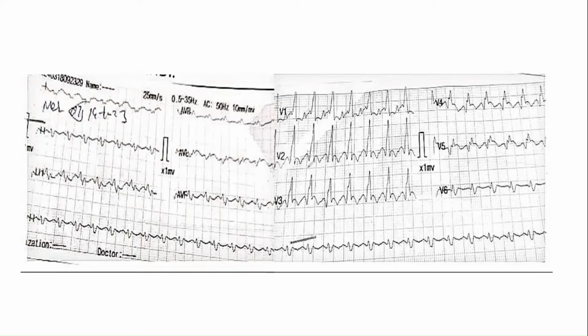You can see, look at over here. They are pretty much the same morphology with the same timing. It is regular. So what do you think these waves are? You said it's a P wave. We did something with this patient. We also thought VT was definitely possible, and based on history it is so important to rule out. With this ischemic cardiomyopathy, palpitations and bad conduction, we were very careful managing this patient.